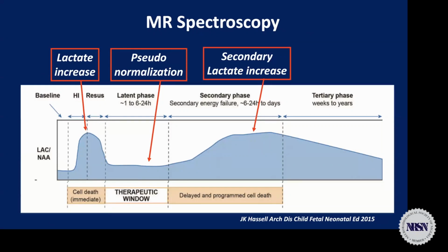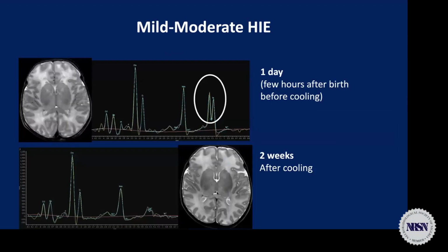So once again, what about spectroscopy? We have a dramatic increase in the very acute phase. We can have a pseudo-normalization in the first day, and then another increase in lactate. So it's important to consider these changes when you study a newborn in the acute phase.